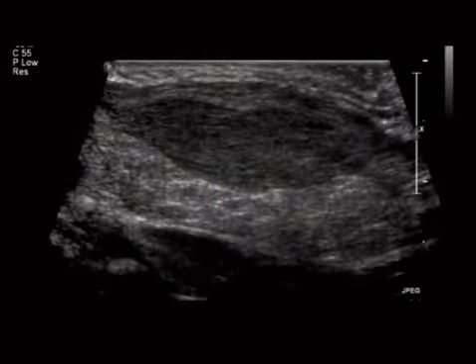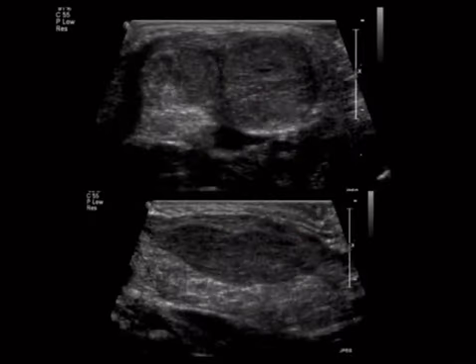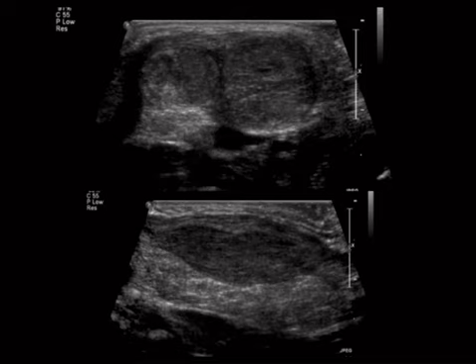All right, so next case, this I will tell you is an ultrasound of the neck in a kid, palpable mass. Do you want to biopsy that? Remember what I said, anytime somebody asks if you want to biopsy, the answer is, hey, is that a vessel? I'll tell you it's not a vessel, but it is something you should be able to recognize, and the trick is actually this here. Notice that there's two of them.